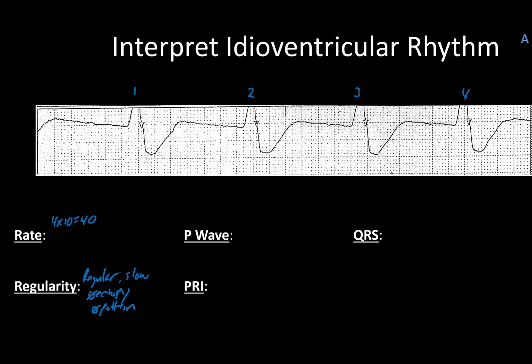It's all just marching out pretty nicely. If we do measurements from about right here, that comes out to 35. If we measure the other one just to be on the safe side, it comes out to about 33. So pretty close to one another.